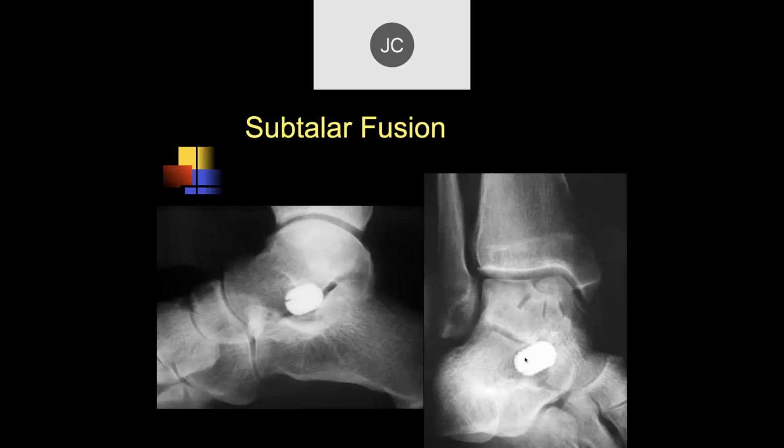We worked on this design at Orthopedic Hospital for USC, and even went to space with it, but it hasn't turned out to be that good. In the back, it probably works a little better. Okay. So that osteochondral fragment has been anchored down there. Is that what those lucencies are? I don't think this has been operated on. No, I don't think so either.